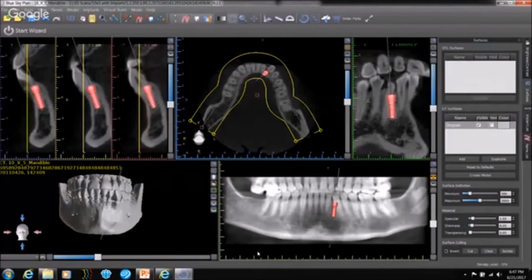It typically occurs around the first premolar canine area, right around that mental foramen, and typically exiting onto the buccal side. I've seen lingual as well, but it's not uncommon to see it, but the majority are on the buccal side. At the same time, it is critical to notice that it's not a good idea to disregard it and intentionally violate it. So it is a critical structure if present.